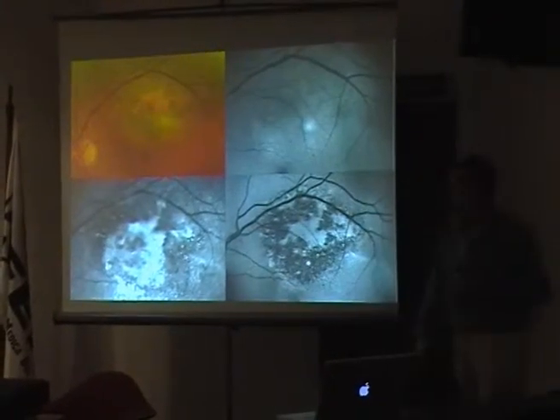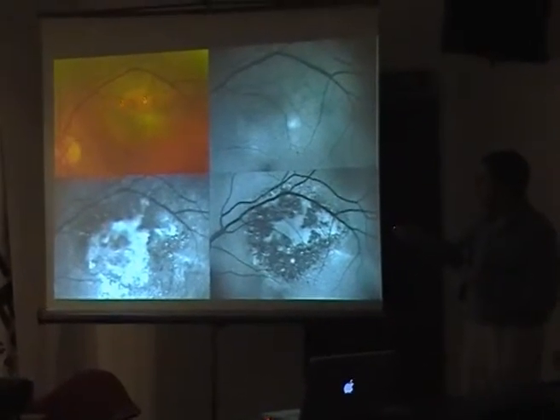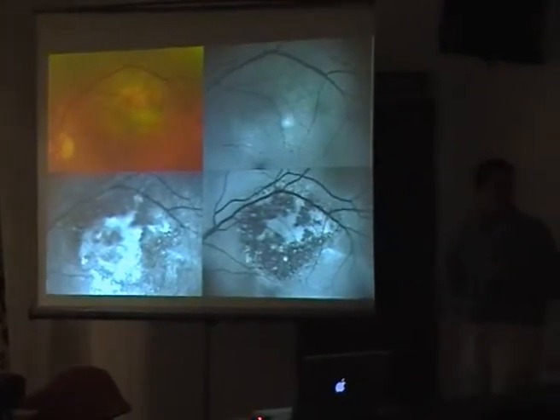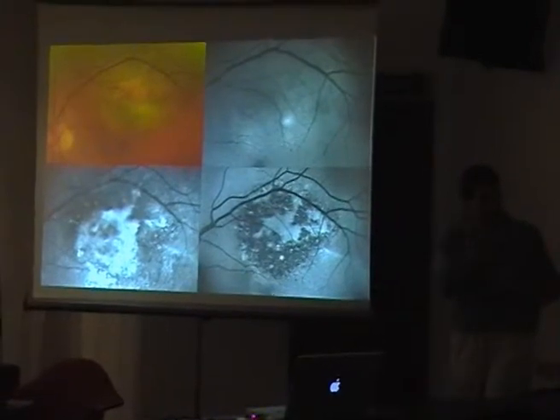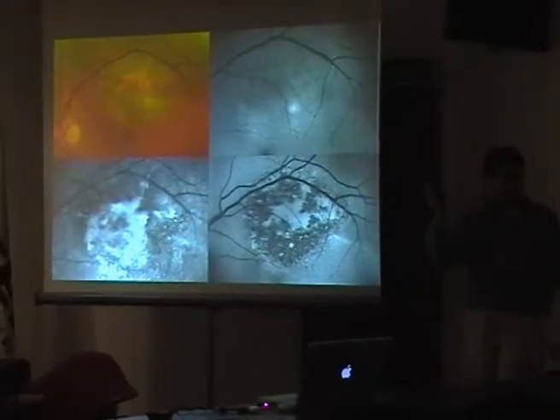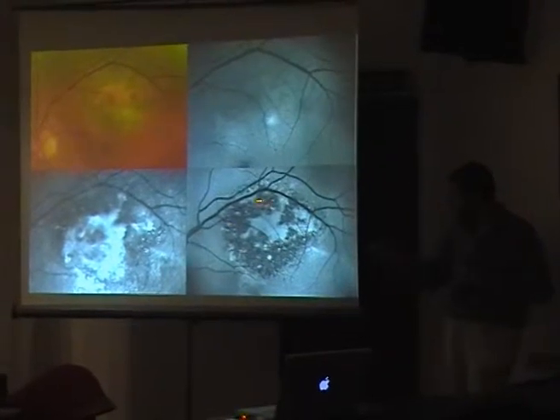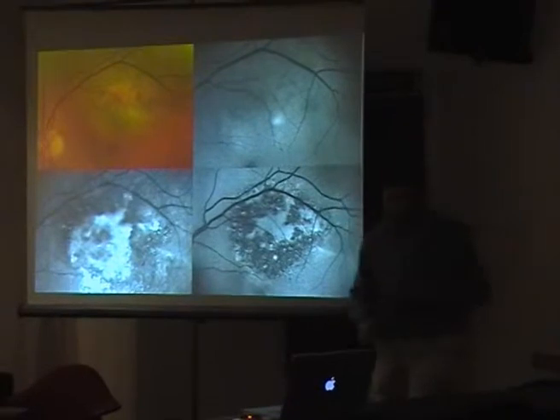Choroidal melanoma: the yellowish material that you see over a choroidal melanoma is lipofuscin. And it's a very well-known bad sign of a nevus. If you see lipofuscin over it, it's a choroidal melanoma. And you see how fluorescent it is compared with the nevus.